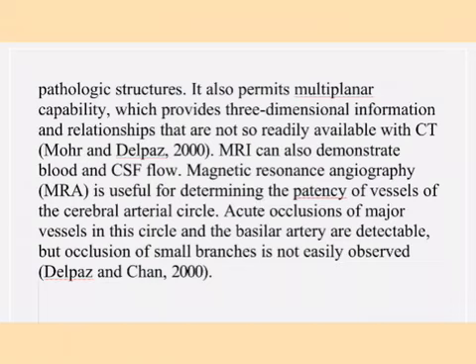It also permits multiplanar capability, and this provides three-dimensional information and relationships. You cannot see this with CT, but you can see that with the MRI. MRI can also demonstrate blood and cerebrospinal fluid flow. There's what we call magnetic resonance angiography.